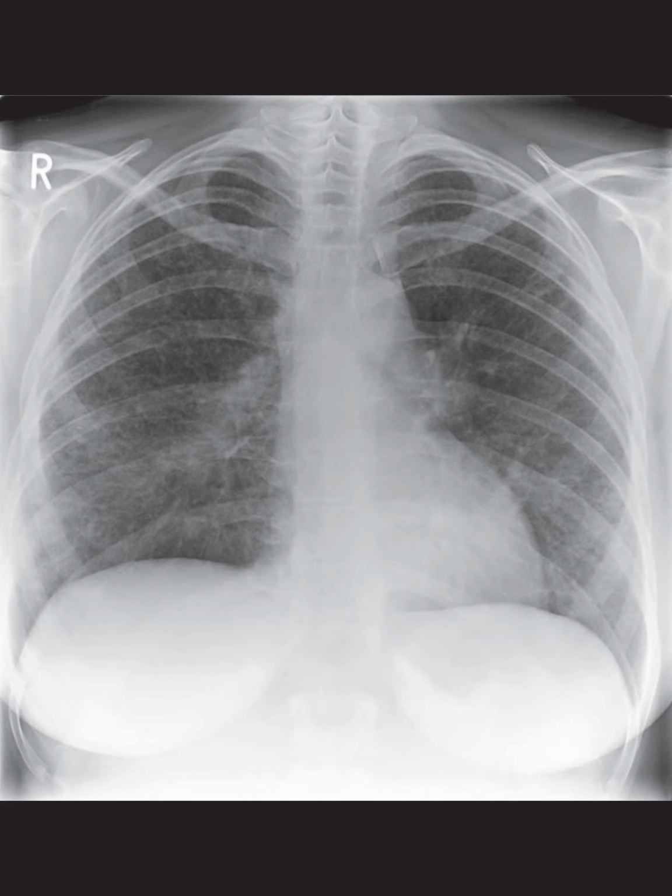Now, the lung volumes are preserved, which is a good sign. There's no pneumothorax here, and the heart size is normal, so that's one less thing to worry about. But what really catches my eye is the appearance of the hila. They're bulky and irregular, without any visible calcification. This kind of pattern really gets us thinking about something systemic, like sarcoidosis.